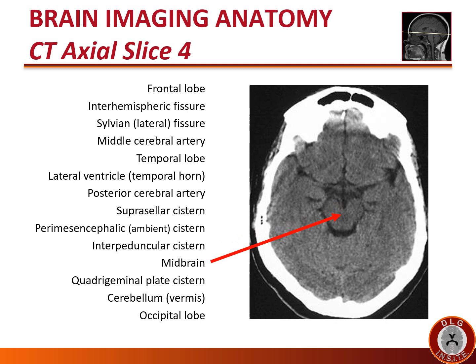At this level, we continue to see the midbrain, now more superiorly, the superior aspect of the midbrain, with its distinct shape. Ventrally, we see the two rounded cerebral peduncles within the midbrain, and dorsally, we see the smaller humps called the superior colliculi. If you look very carefully, right in the middle of the two superior colliculi, and maybe just ventral to those colliculi, is a black dot, which is the sylvian aqueduct, also known as the cerebral aqueduct. Still at this level, we see the CSF space behind or dorsal to the midbrain called the quadrigeminal plate cistern.